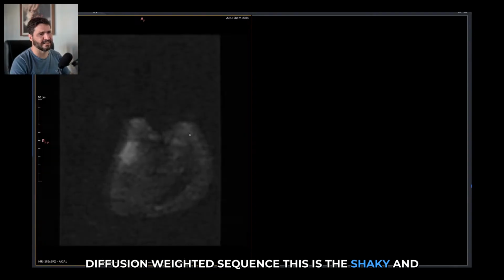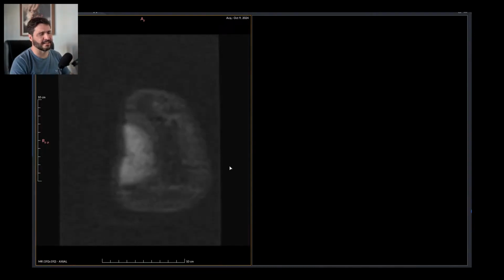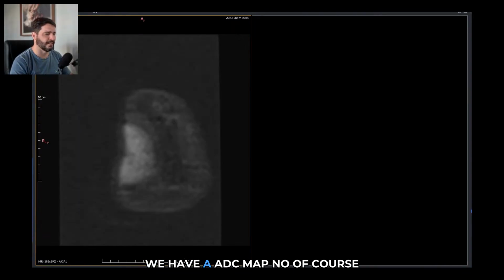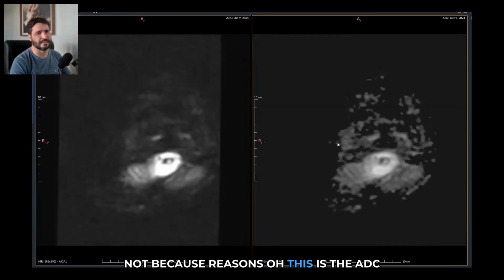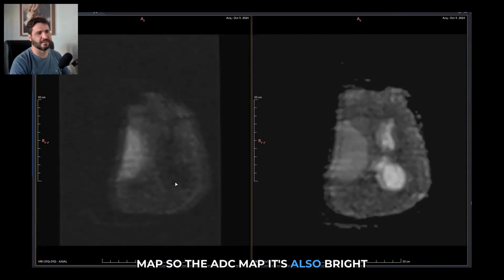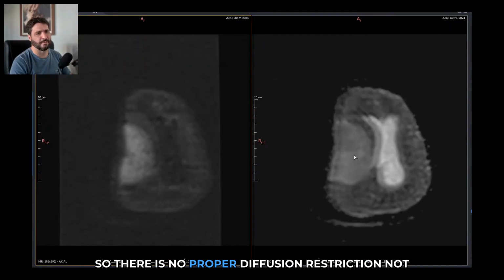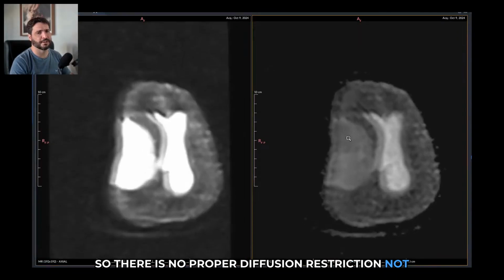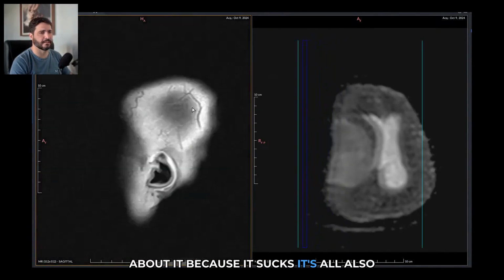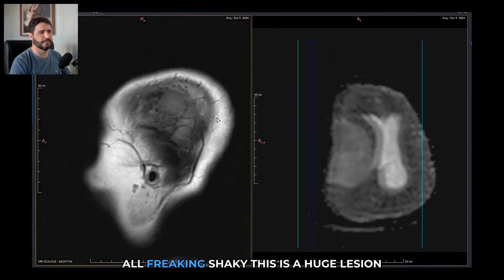This is the shaky and useless diffusion weighted sequence right there. It's bright. Do we have an ADC map? No, of course not, because reasons. Oh, this is the ADC map. So the ADC map is also bright, so there is no proper diffusion restriction, not more than the adjacent parenchyma, so let's forget about it because it sucks. It's also all freaking shaky.